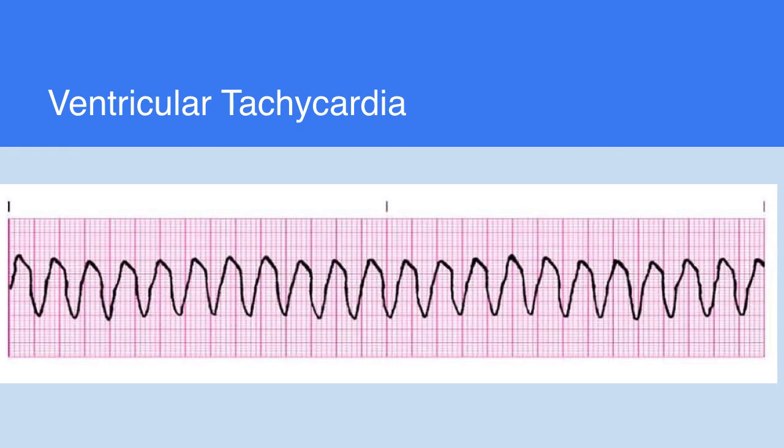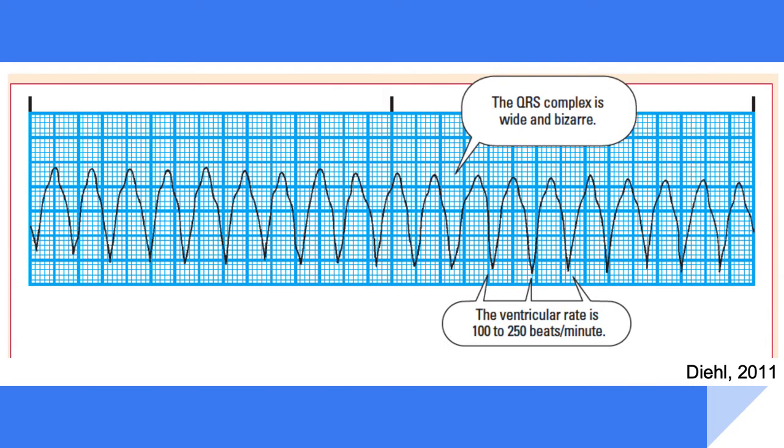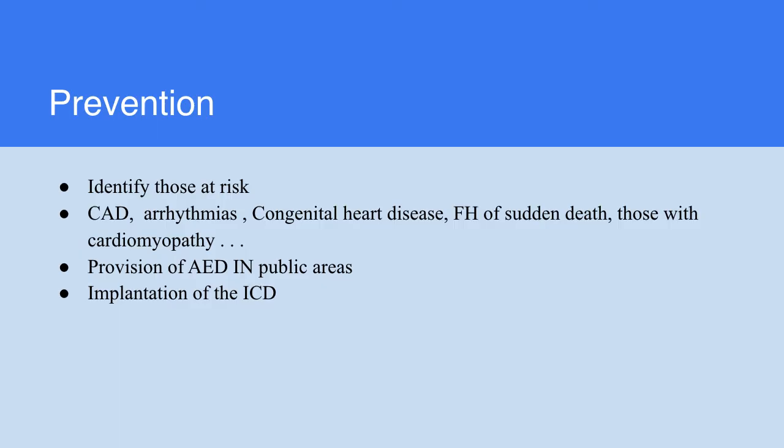This is a run of ventricular tachycardia, regular large QRS complexes. Again, large QRS complexes. And those slides are all from Google Slides.